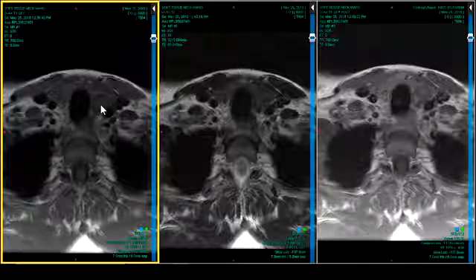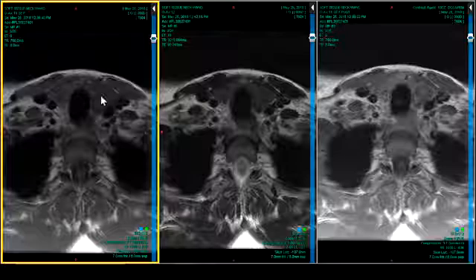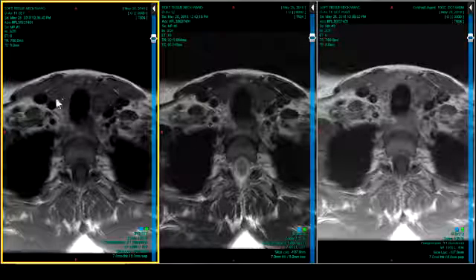Now, we don't have the answer yet, but I can tell you the calcitonin levels were elevated. That much I do know. I found that out 2 days before coming to this course. So this patient's going to have medullary CA of the thyroid. Now, I don't know if he's got one or more, so the search isn't over yet. This patient needs to have abdominal CT and pelvic CT.